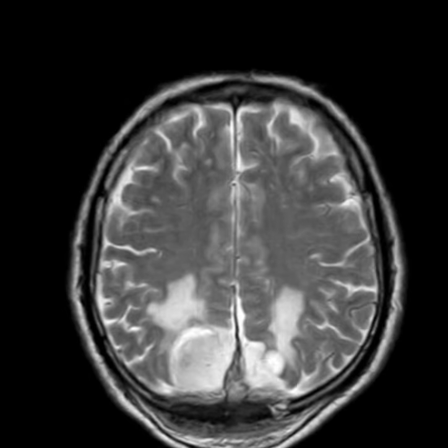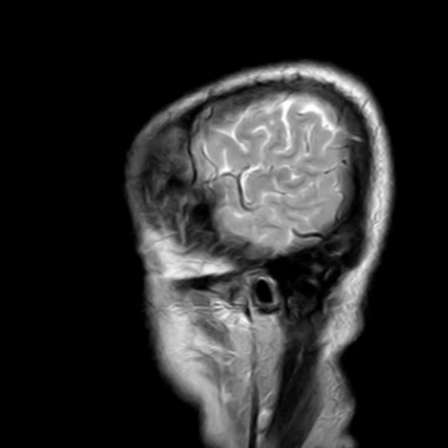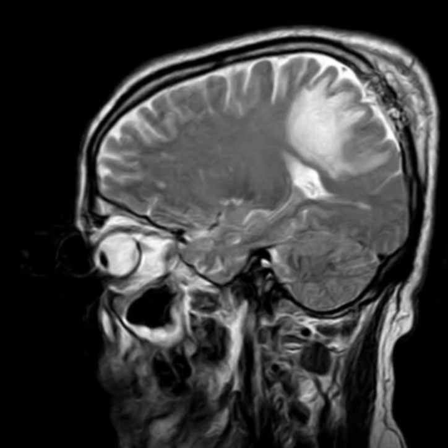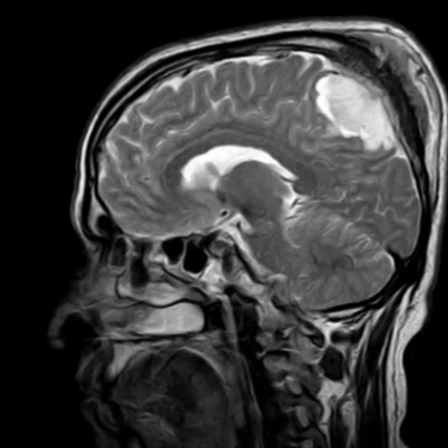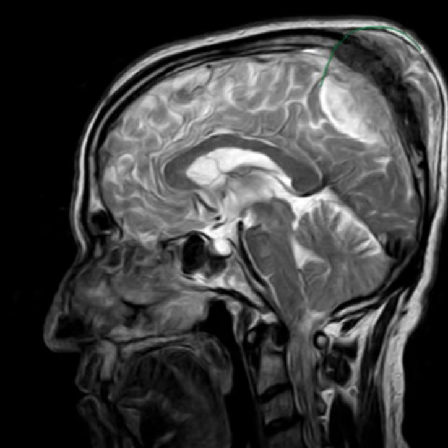Do we have sagittal images? Yeah, sure. So these are sagittal T2 weighted images. And here I can see that there is a lesion that is extra-axial located at the posterior aspect of the midline at the level of the parietal bones, and this lesion is involving the inner and outer tables of the parietal bones and is extending into the subcutaneous tissues of the scalp.